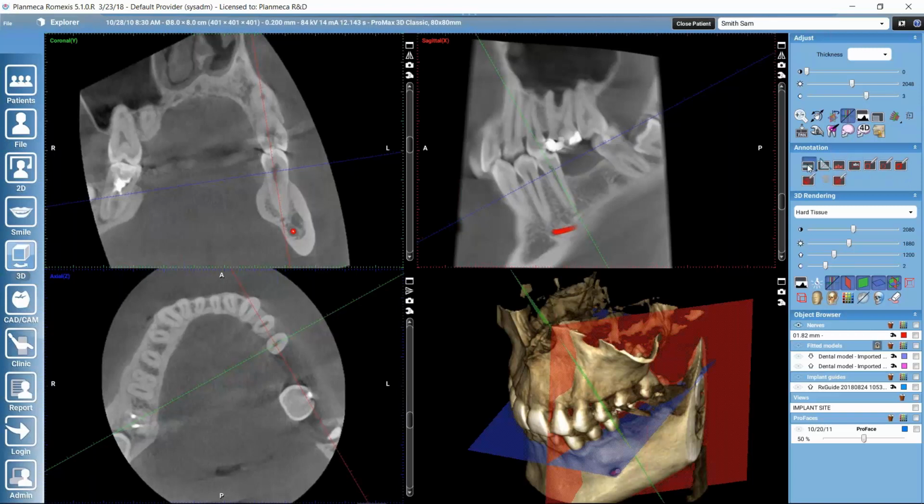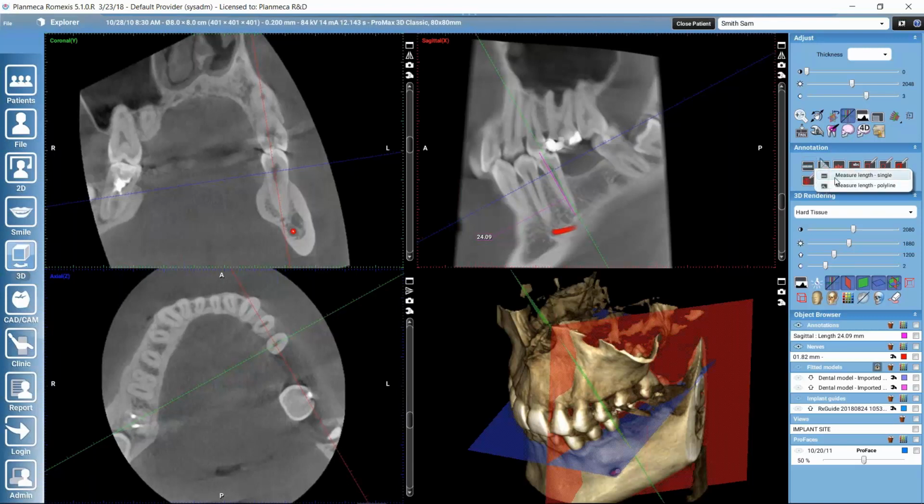So for example, if we activate here the measure length, I could just simply track with my mouse the length on top of this tooth, and here I have selected in default settings, so this icon here, an option that allows me to place this measurement label manually. So now it stays here attached to my mouse cursor until I click somewhere in order to attach the label there. And if I would click here on the lower right corner of the icon, I could have several options.